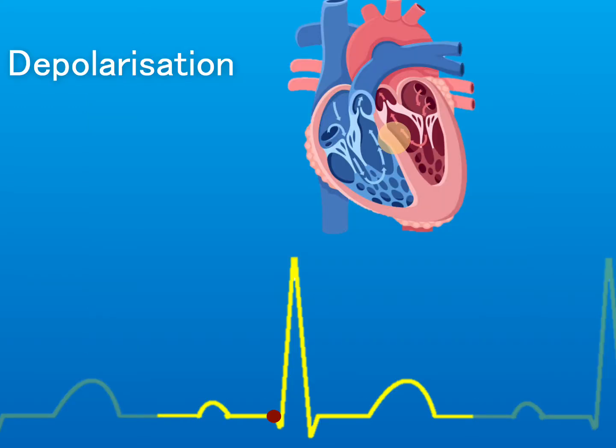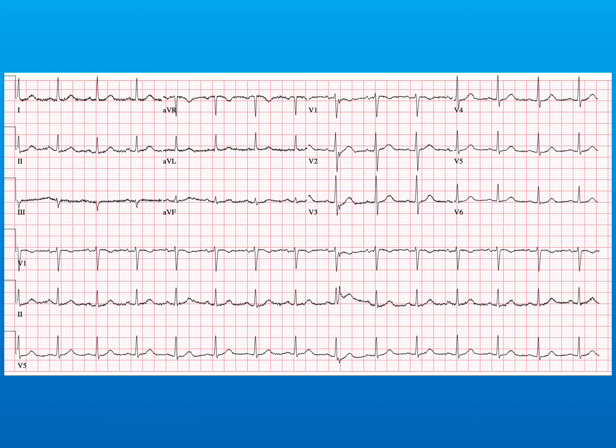So the T wave normally is positive in a lead where you have a positive QRS complex, and this is because a wave of repolarization occurs in the reverse direction. So it happens from epicardium to endocardium. So the normal T wave is slightly asymmetric, positive, and it is relatively small with respect to the QRS complex.